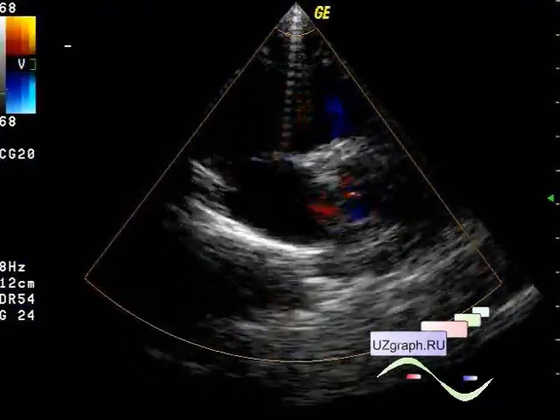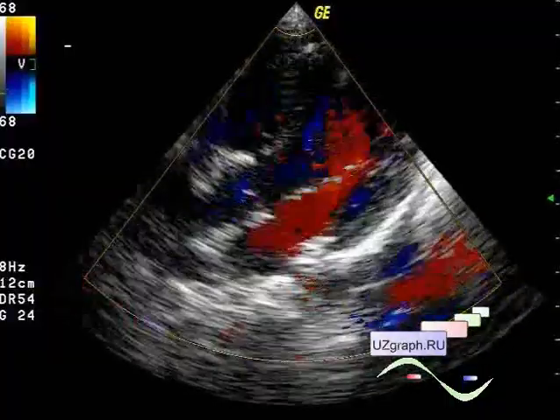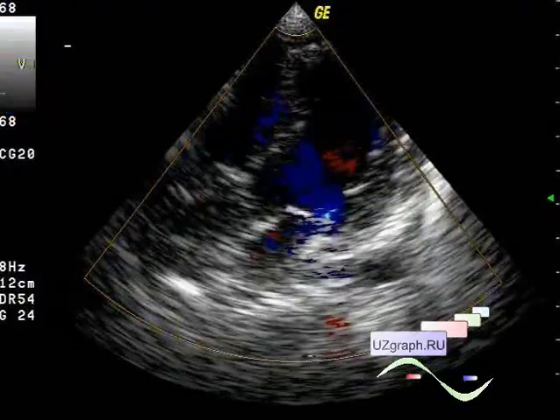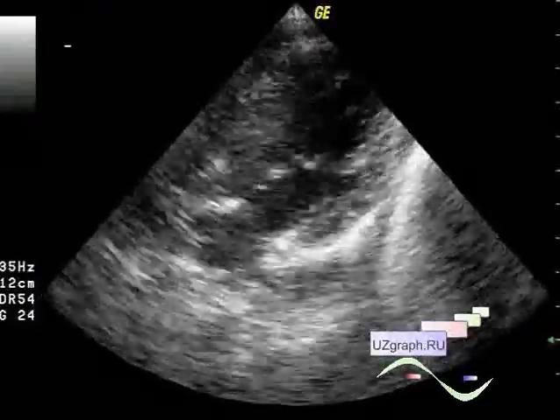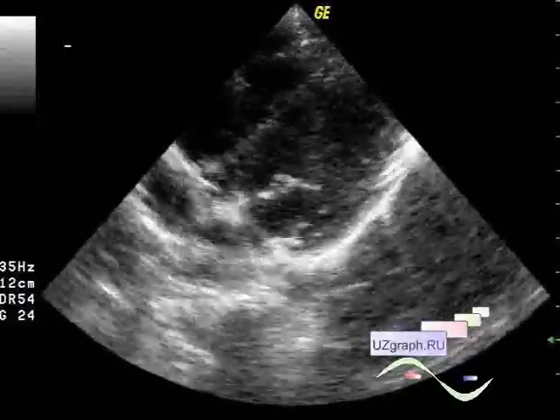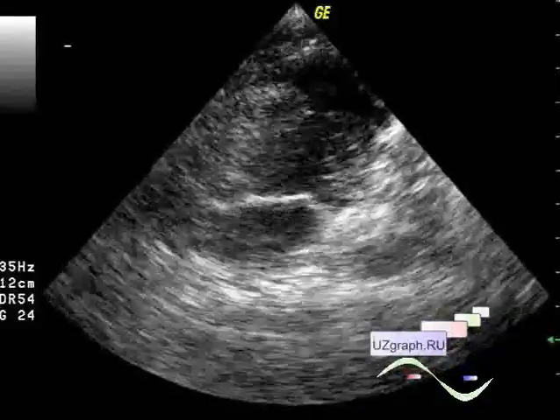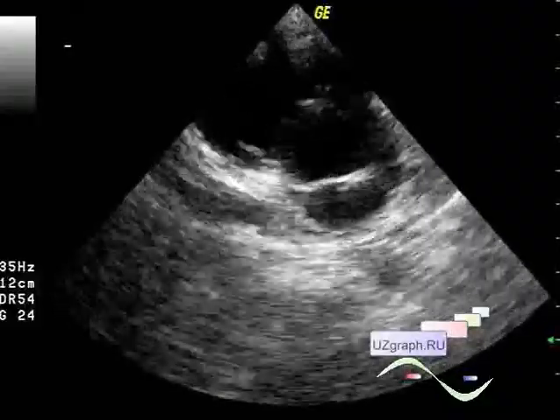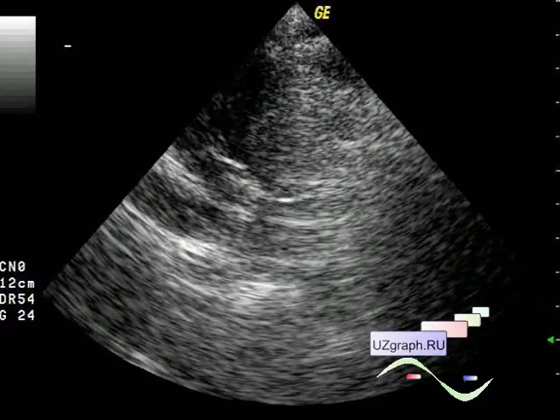But this requires a powerful computer, and sometimes it is not available. Sometimes old processors are used in scanners, and the color flow picture starts to dramatically decrease the frame rate, and in that case you need to make this area smaller.